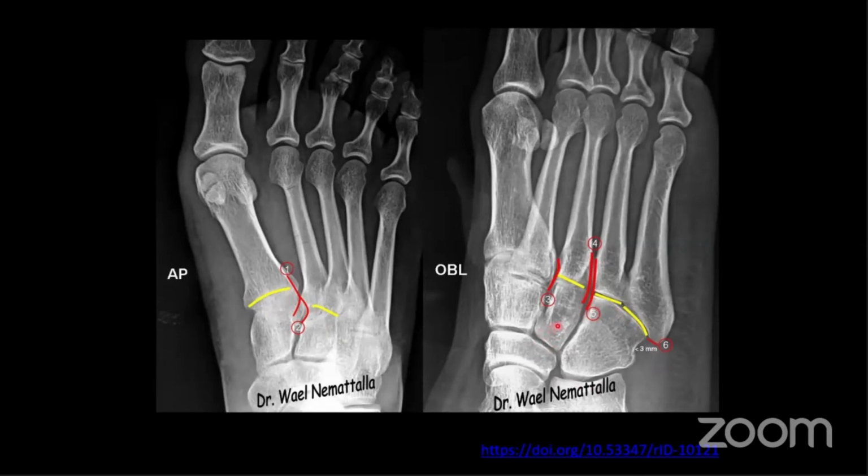The only real exception is in older patients with degenerative disease, where you can get asymmetric narrowing of certain joints. For example, the talonavicular joint and the more proximal joints here are commonly affected by degenerative disease. So you can see some narrowing here compared to the rest of the midfoot. But broadly speaking, these spaces should all be regular.